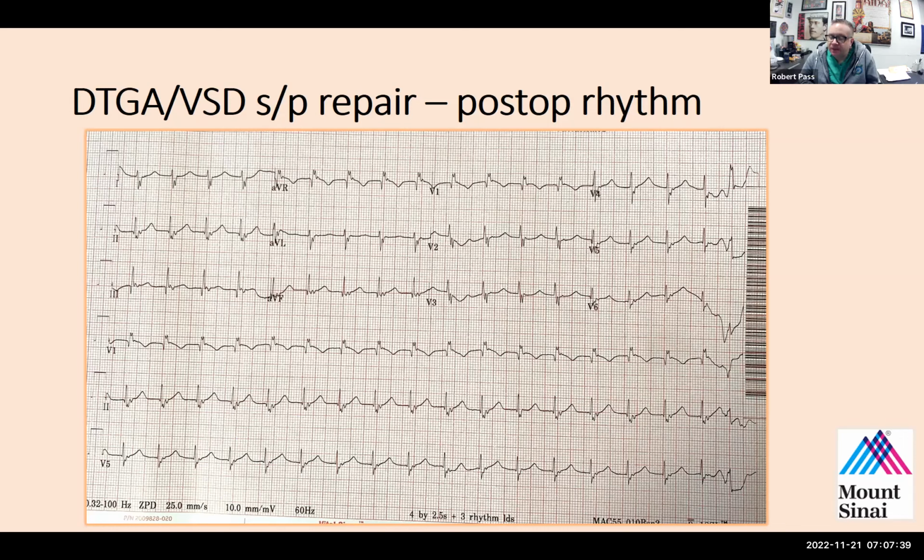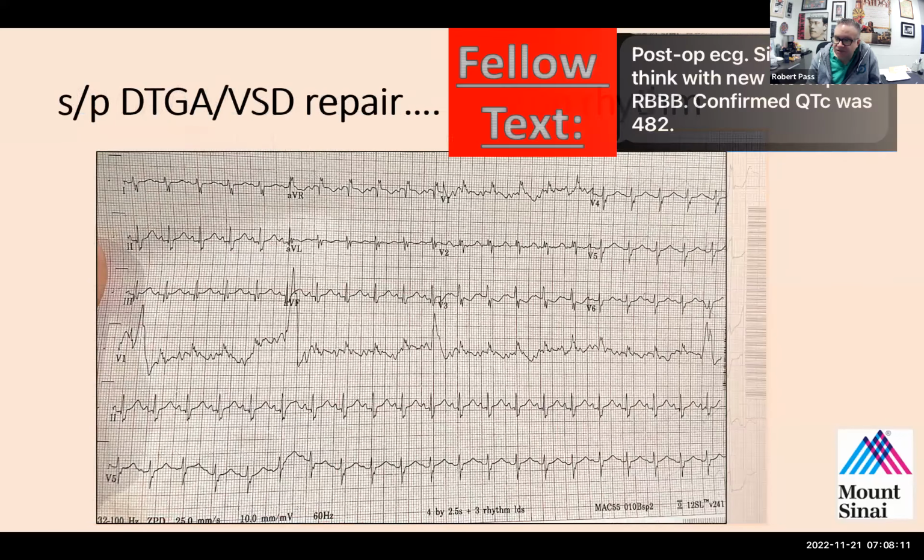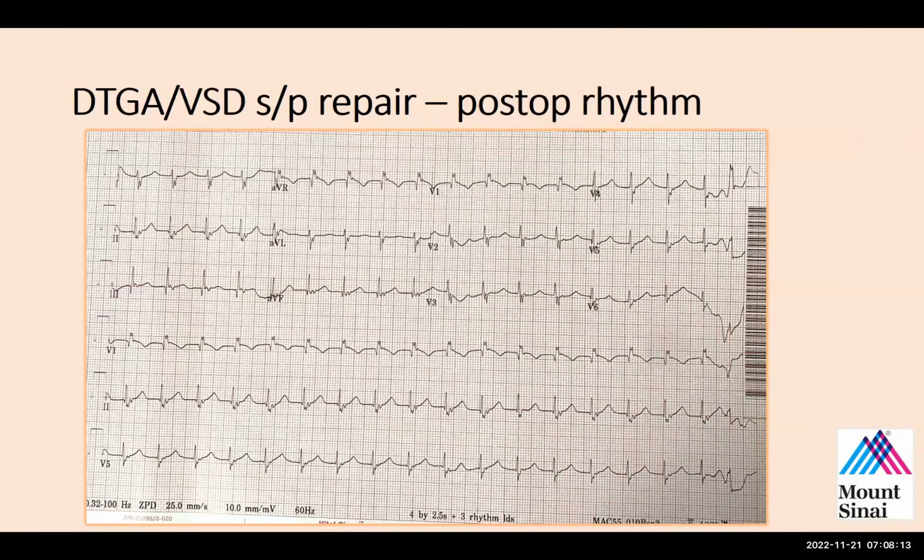Again, I'm going to show you once more. This is the patient's electrocardiogram in sinus rhythm. And this is the patient's in this rhythm. So again, I'll show you sinus rhythm. I think the QRSs are the same, and then there are P waves after each QRS. I agree with that.